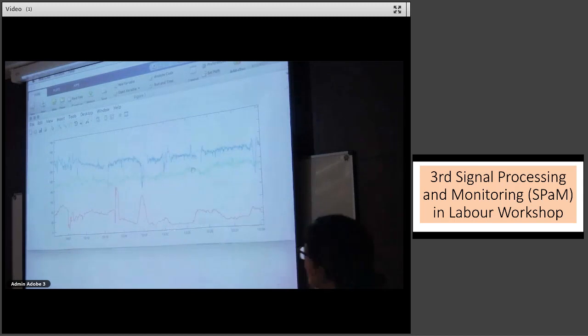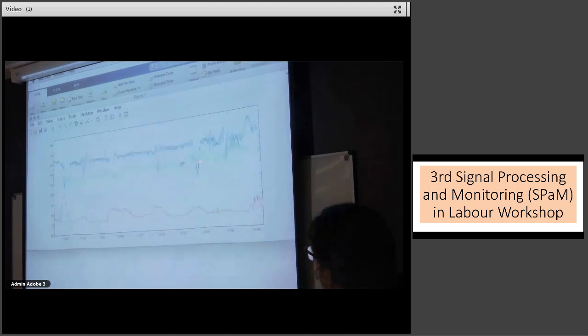Okay. So here maybe there is a change. Diogo? No, I think there's one deceleration. It looks like the rate is going up. No, the rate is 120, but we started at 115, 110, 115. So there's a change, but it's an insignificant change.